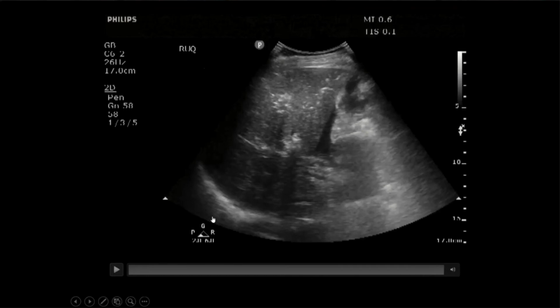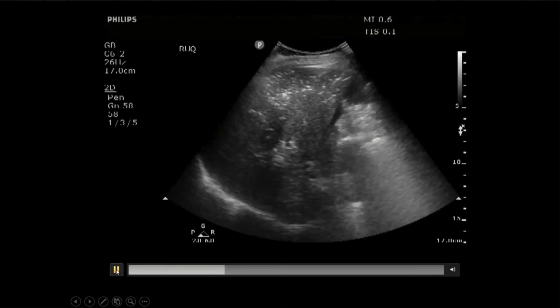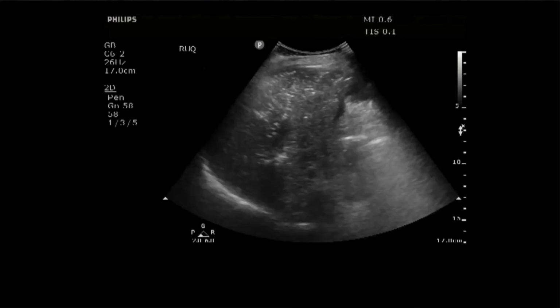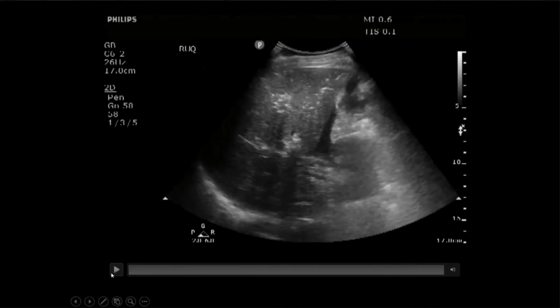And what else do you notice is going on in this image? So there's air here, and what do you have right here? Kind of filling up the space here, not really the shape of a gallbladder. It could, yes, it's ascites. It's free fluid. And what exactly the cause is, is hard to say. What if I told you that this person has a perfed viscus? So where do you think all this air is?